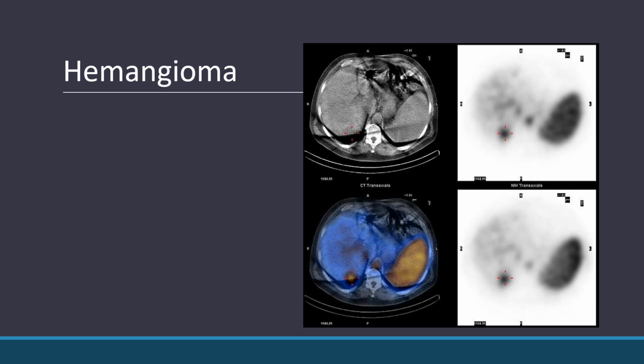So let's talk about the liver hemangioma study. On this first image that you see here, this is a SPECT-CT study, which is fairly common with hemangioma, to do a SPECT or SPECT-CT. And that's because really we're looking to see if it's cavernous. And the only way to see if there's necrotic tissue within it and if it's cavernous is to look at it in the 3D plane and look at it from different views.